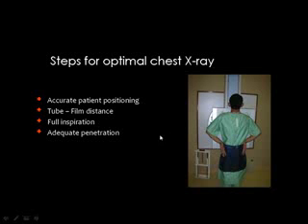And these criteria are concerned with the accurate patient position, like this one, adjustment of the distance between the film and the X-ray tube, instructing the patient to have a full inspiration before the radiograph is obtained, and adjusting the radiographic factors according to the patient size.